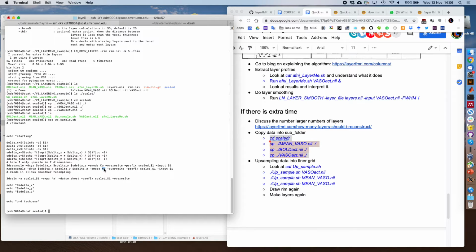The way how k-space works is that we have a centroid, and that's kind of an overall weighted average of the entire signal in there. So the only information we have is the voxel centroid location and the value of that. So I don't see that we should use nearest neighbor interpolation and assume that the voxel is homogeneously filled. It's a weird assumption.